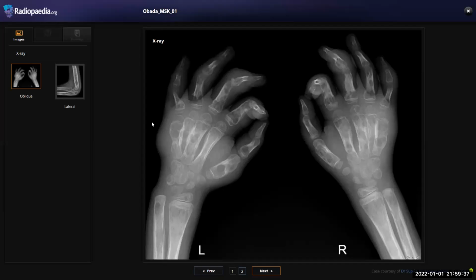has 4 types of appearances: the cystic type, which is like this. This is the more common type, and the infiltrative type, which is like another osteomyelitis, and the focal erosion type, and the spina ventosa, which also comes in the exams. Just one finger with the ballooning of the finger.